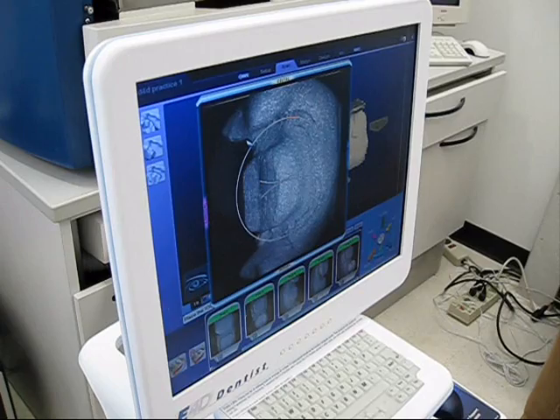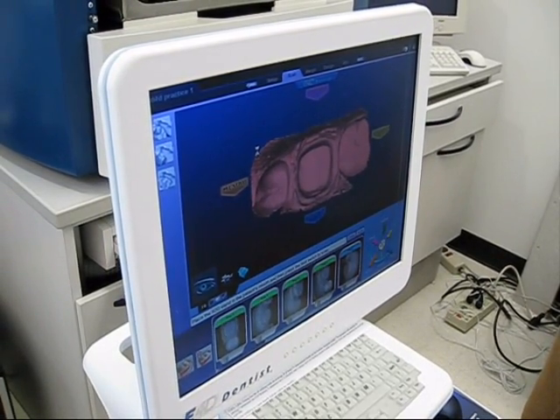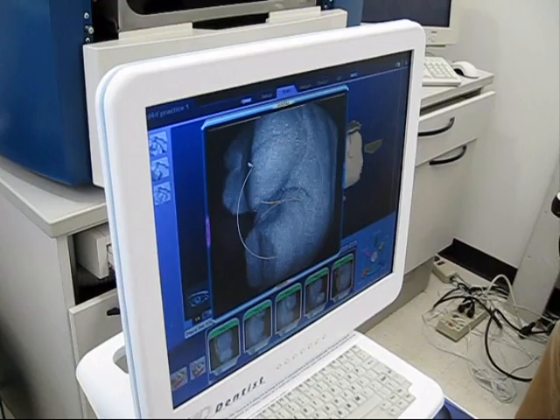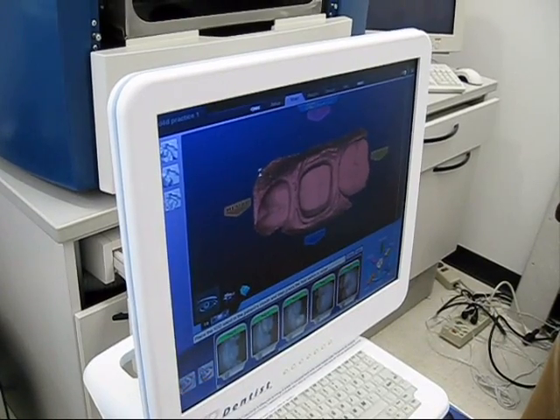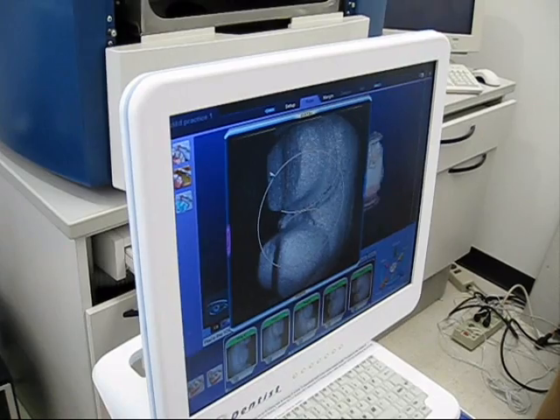Oh, it will? Yeah. Okay. If it's red, it'll automatically throw it out. If it's yellow, it'll keep it. Yellow just indicates that maybe you didn't get enough information from that scan, so maybe the alignment was not correct. It sounds like to me that if I got a yellow scan, I'd chunk it. I would too. I'd like to get all the data that I can.